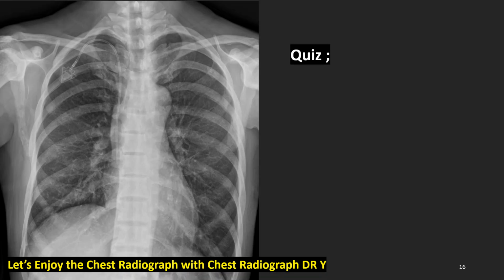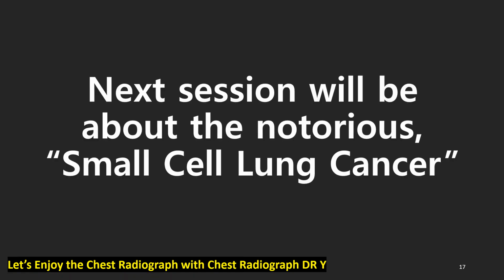This is the quiz for the next session. How is her condition? Next session will be about the notorious small cell lung cancer. If we finish the next session about small cell lung cancer, we will be quite confident about lung cancer on radiographs and CT scans. Good luck.